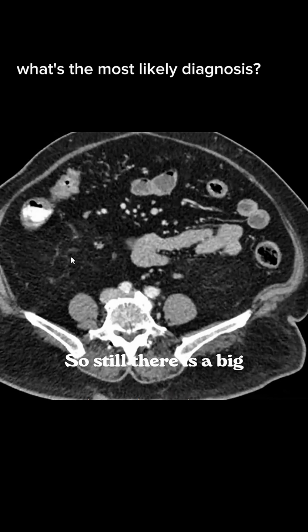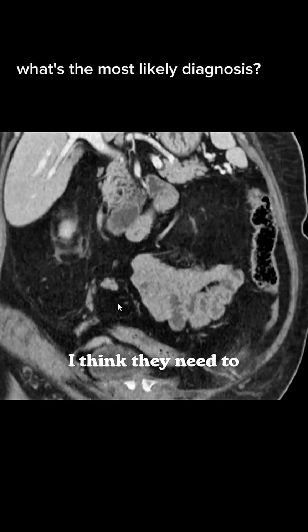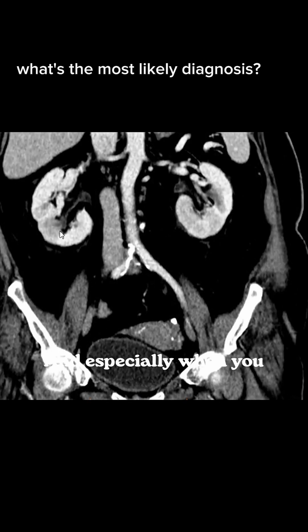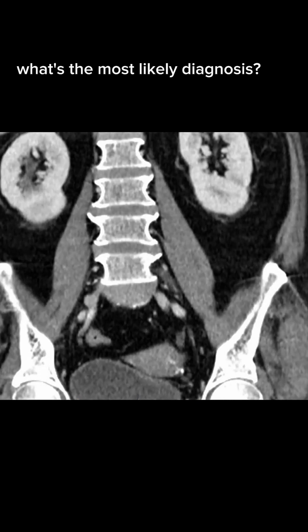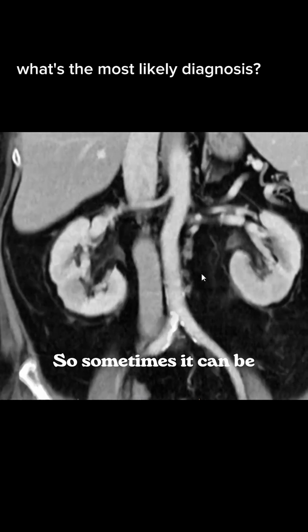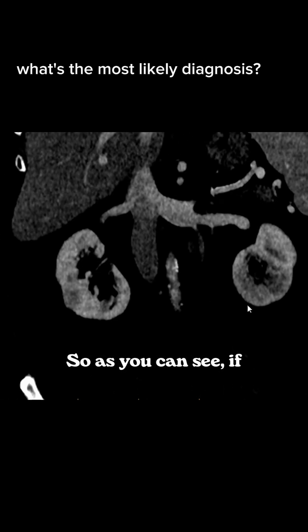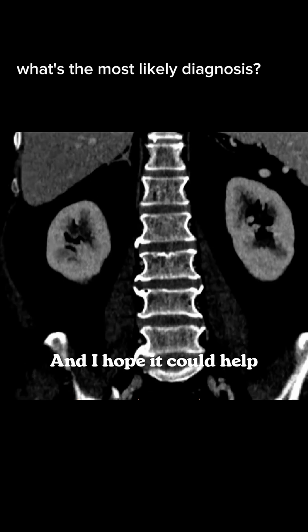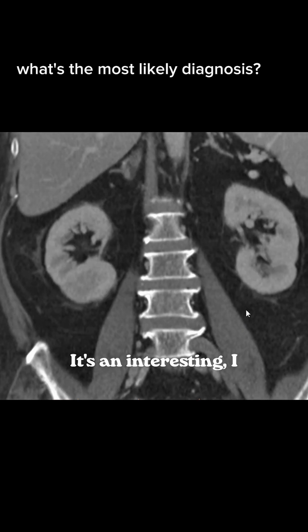But the teaching or learning point that I think could be helpful here, if someone sees this case, is that they need to check the kidneys in a systematic way, especially when you have a big question like how you will explain the fever of unknown origin. Sometimes it can be subtle, and the kidney is one of these important organs that we have to check. As you can see, if you didn't make the effort to check the windowing and to check it clearly, maybe you'll miss these lesions. And I hope it could help the patient to know what he has in this case. Was it interesting? I think it's an interesting case.